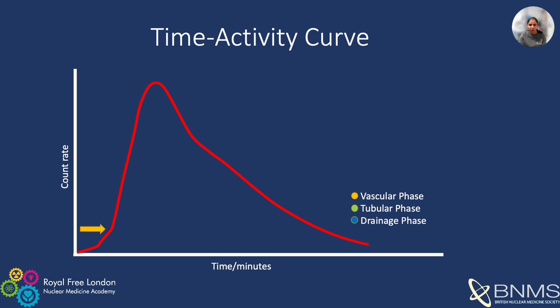During the perfusion phase, the transplanted kidney normally becomes the hottest structure within 2 to 4 seconds of activity appearing in the adjacent iliac artery after a good bolus of radiopharmaceutical. However, achieving good perfusion images is extremely difficult, especially because most patients with renal transplants have limited vascular access as a result of prior dialysis.